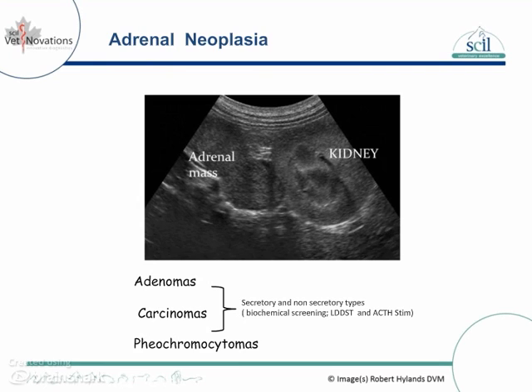This first image shows a uniformly enlarged adrenal gland in contact with the associated kidney. This proximity makes it seem obvious that this kidney would be at risk for tumor invasion. Fine needle aspirate, biopsy, or surgical excision and histopathology would be necessary to identify the neoplastic tissue.